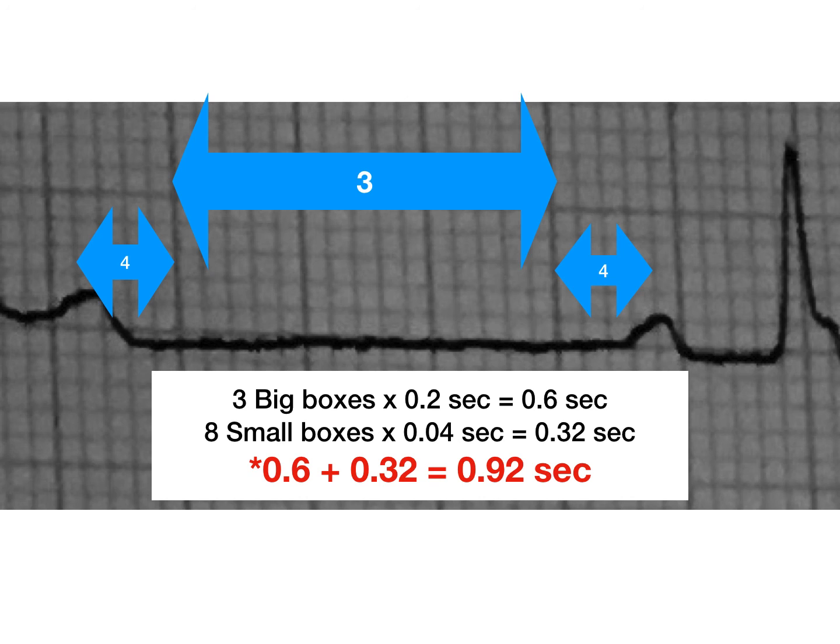When you sum everything up, you can see that the answer would be 0.92 seconds. So there you have it.